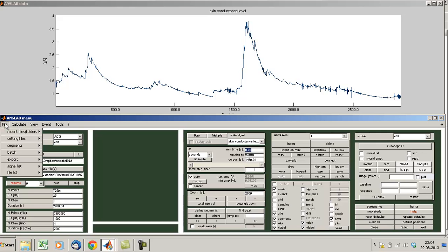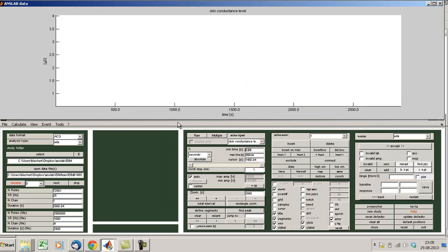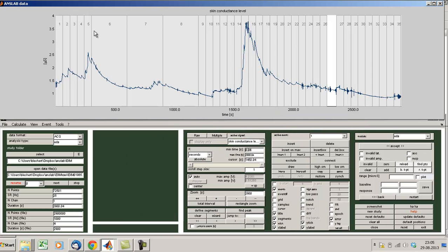One useful feature often is to display segments which represent the time scale of the experiment overlaid over the signal, such as here, for example.